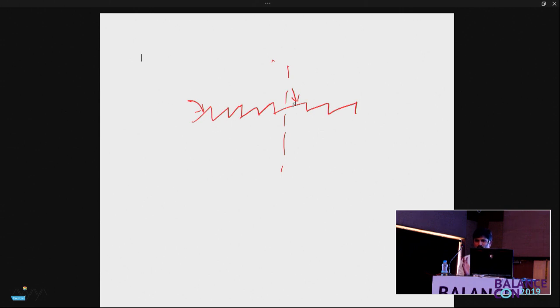We are going to look at this line graph and tell exactly what is going on in the inner ear. Does that look exciting? You look at a graph and tell what is going on in the inner ear, because the inner ear fluid flows, you are not amenable to any other way of looking at them. The best way of looking at what is happening inside the inner ear is by looking at the eye. Shall we undertake this? For this we need to do a small exercise, all of us.